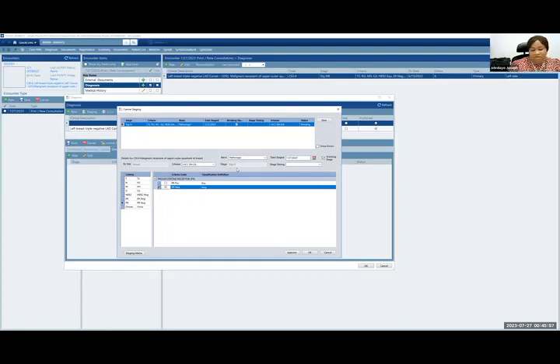So now it has staged her for me as a stage 4. And this stage timing now is post-chemotherapy because she had chemotherapy before. And this is, again, based on clinical findings, not on pathology findings. And I'm going to approve this stage.